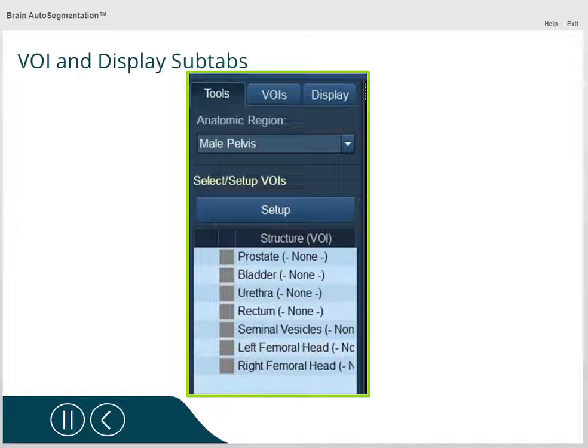Recall from the contouring e-learning that you must be completely satisfied with the appearance of the structures on the CT. This is what the precision system will use for optimization and calculation. If not satisfied, you can repeat the auto-segmentation for that VOI and/or return to the fusion task if necessary. By now, you have likely noticed there are no editing tools within this step. If you need or desire to make edits, you must move to the contour task.